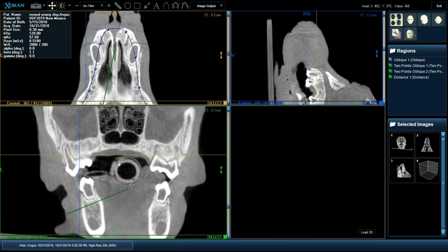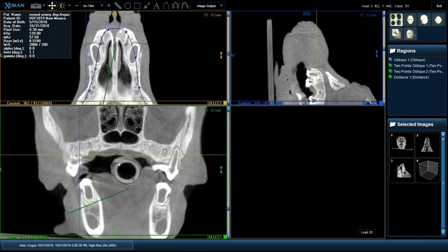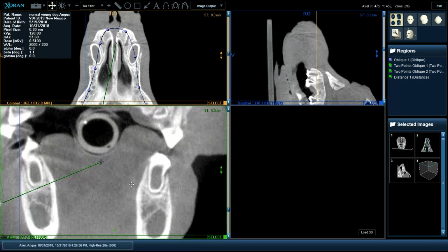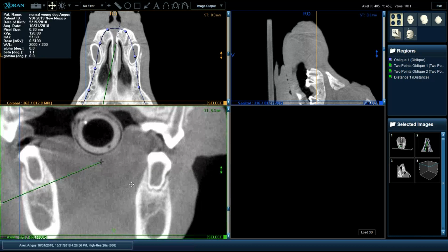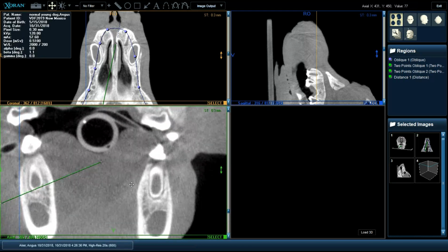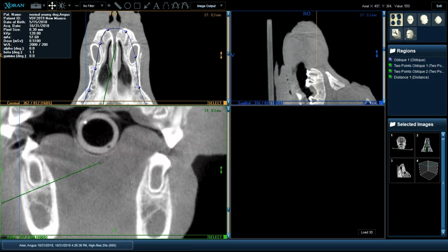You can see the furcation areas are closed, bone in between the roots. And this would be the normal sort of bone level to expect. If we zoom in, we can actually zoom in pretty precisely. And this is the sort of bone level you would expect around the root. This is buccal, this is lingual.